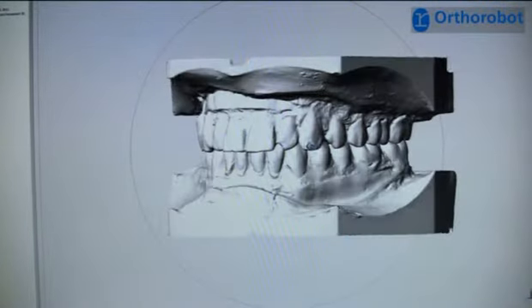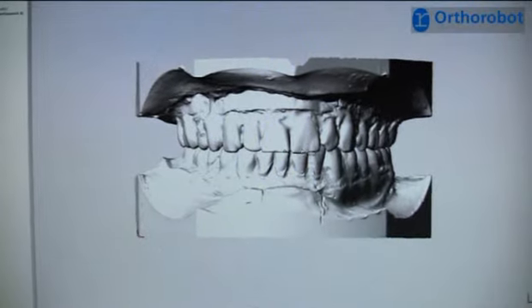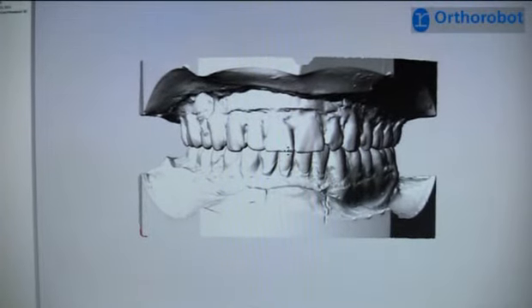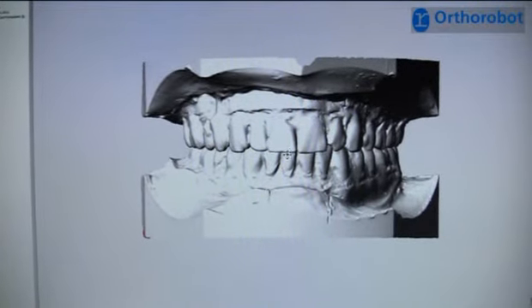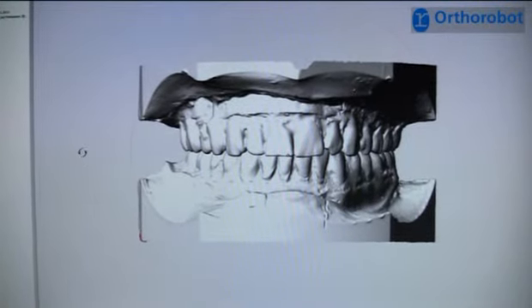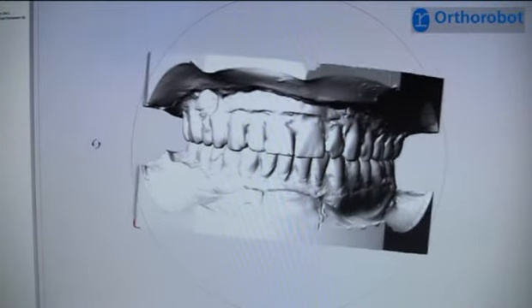I can now click into the model, and while holding the click I can move the model. If I click and hold the yellow dot in the middle, I move the model without rotating it. By clicking outside the model, I'm able to rotate it around one axis only.